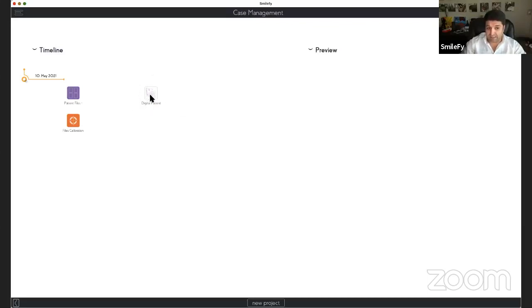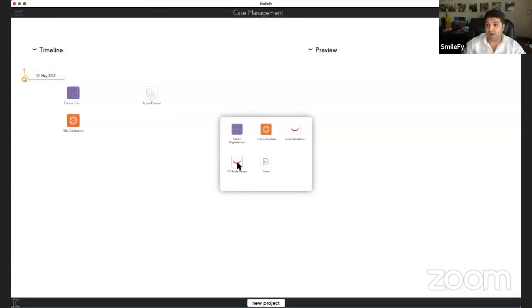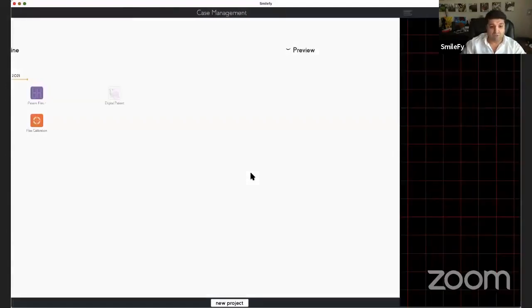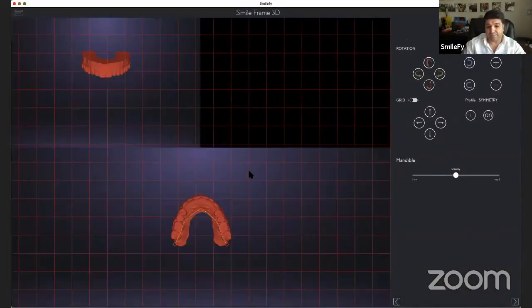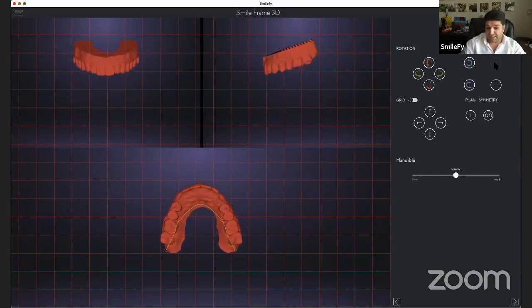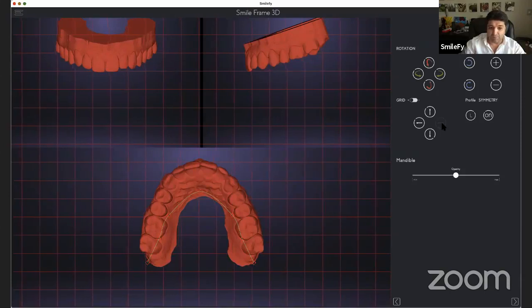As you can see the icon here, we do have the files, we do have the calibration project, and we have the digital patient. And now I'm going to start the mock-up, and it is 2:09. So let's make sure that we get the mock-up in less than 10 minutes. In the first screen, because that's the idea, to offer the patient the first appointment mock-up.